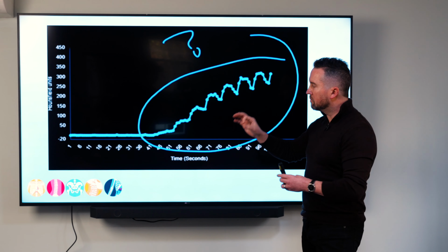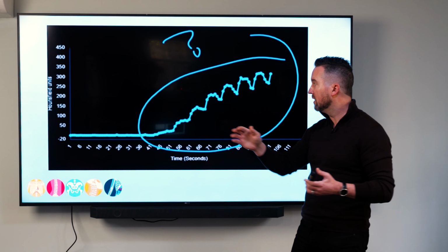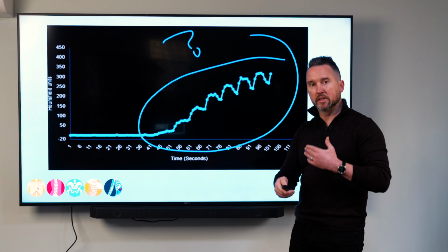So then we were excited about that. And then we started putting regions of interest inside of certain parts of that patient. And we started having big problems here. This is not what real life looks like. So we just had to make adjustments and adjustments.